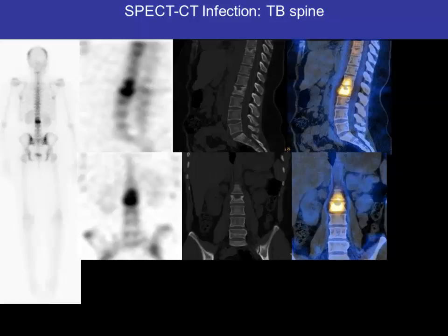So that's what we would have said, because the patient's got pain. But the only thing is she was an Afro-Caribbean with back pain. She was around 35 to 36 years, so our suspicion was whether this patient must have tuberculosis. So in this case, we had SPECT-CT done. As you can see, there is destruction of the L2 vertebra, and also there was a psoas abscess adjacent to this region, and a diagnosis of osteomyelitis was made on culture basis. So we raised a possibility of osteomyelitis because of the age and the ethnicity, and also it's very rare to see a 35-year-old having a vertebral fracture unless she is severely osteoporotic or something like that.